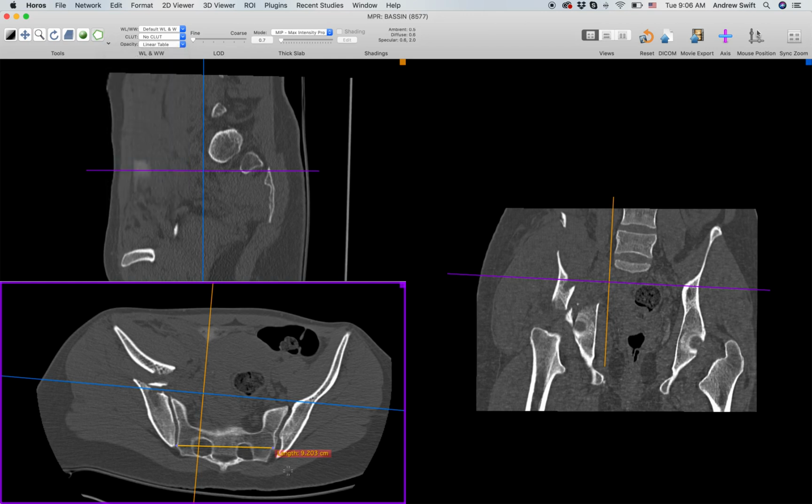It's designed to allow people to, if you wanted to select the volume of the pelvis, for instance, you could do this. And let's see here, I should be able to, whoops. Well, if that were at all visible, hang on a second, let me do that again. What I'm getting at is that once you trace this thing out, it will give you a mechanism to calculate the volume.